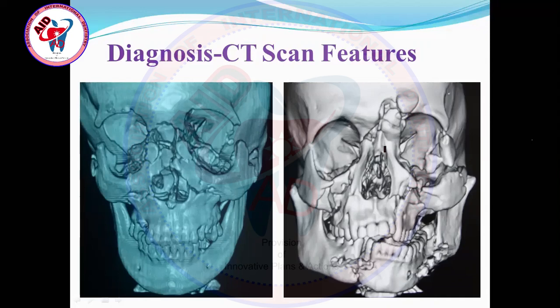mandible also. And there's fracture on right side, and this case was referred to me over there, and was treated in periphery by some general surgeon or someone else, and there's maltreatment of this case. Only mandible was treated with the large bulky plates, not with the mini plates. And we have redone all these fractures. Then we'll see in the coming slides also.